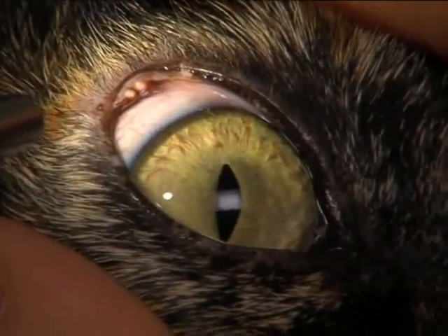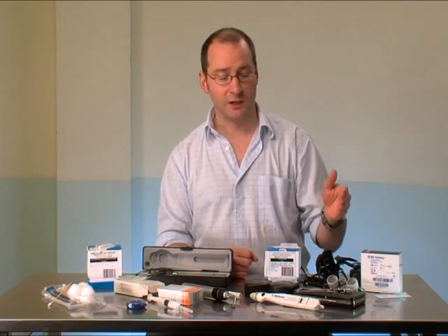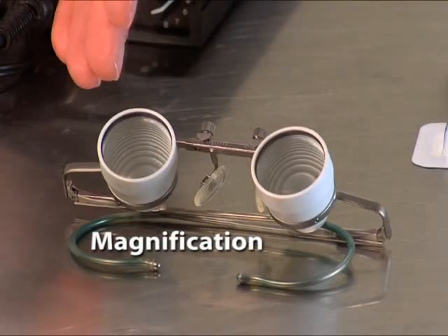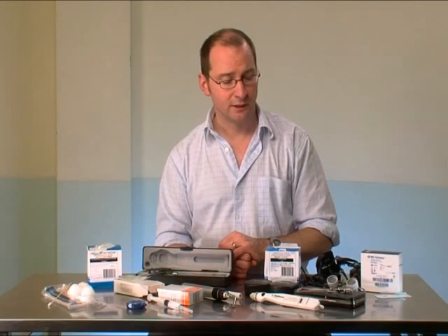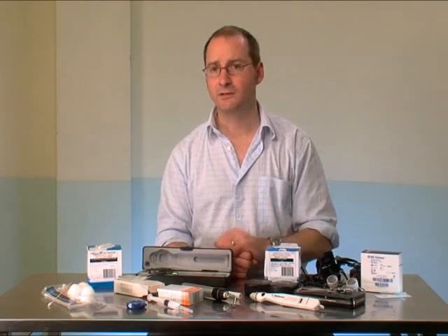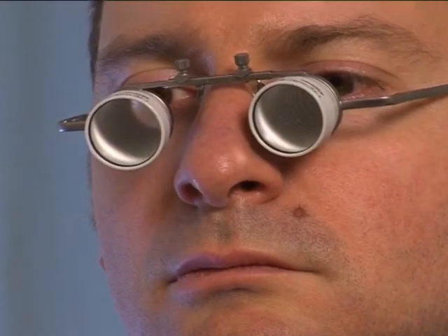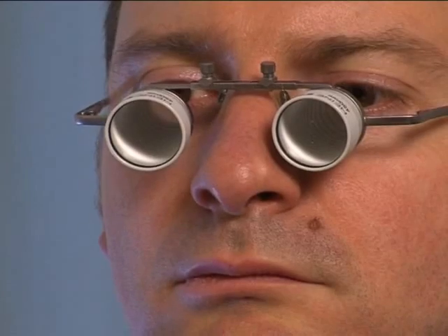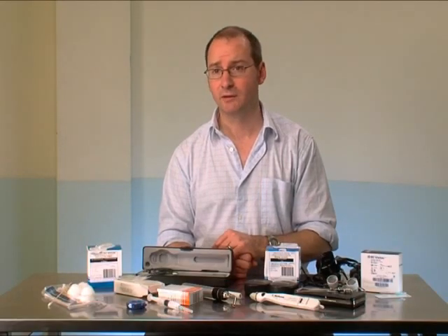Other possible equipment you would consider if you've got an abnormality that you want to have a closer look at, particularly if it is on the external surface or involving the cornea or the eyelids, then some sort of magnification is handy. For example, the loupes we've got here give you about 2.5 times. You can get them up to 4.5 times. They're quite expensive, but if you've got an interest in the field, then I would recommend looking at getting some form of magnification to assist.